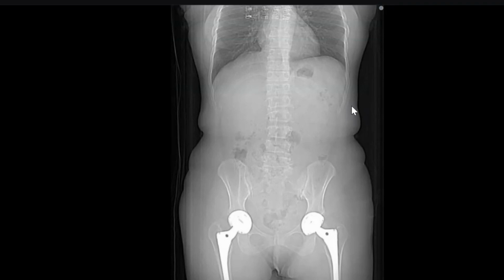for the CT scan, and it showed that there is a bilateral hip joint replacement. Otherwise, the rest of the hip joints appear within normal and both femurs are within normal. In my routine practice, I want to review the previous images prior to the surgery to see why they replaced both hip joints.